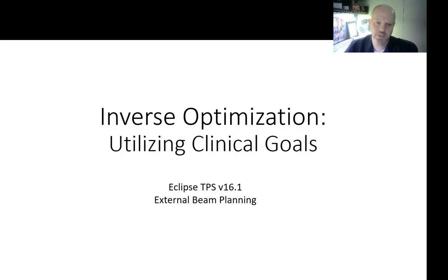Hi, my name is Justice Adamson, and in this video we're going to talk about utilizing clinical goals. It's kind of the basics of that when doing inverse optimization in the Eclipse treatment planning system. All right, let's get started. So let's open our planning system here.